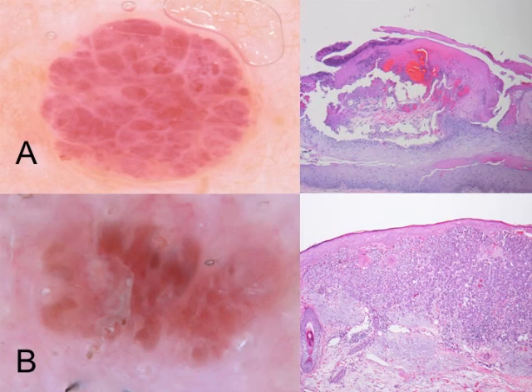Lesion A was a classic hemangioma. Lesion B, on the other hand, was a melanoma. Melanoma on rare occasions can present with lacunae-like structures. However, on close inspection, one will often see blood vessels coursing through these red blotches, and the red blotches will not be separated by septae.